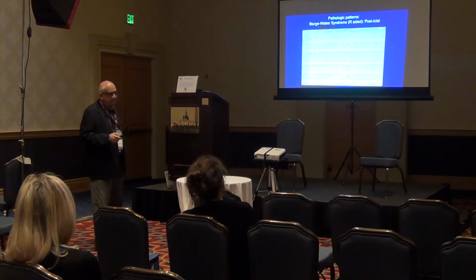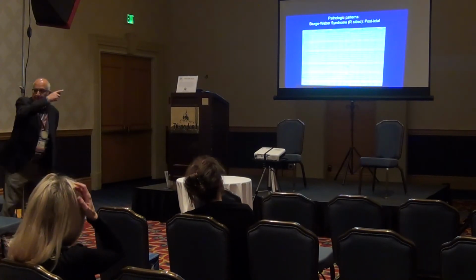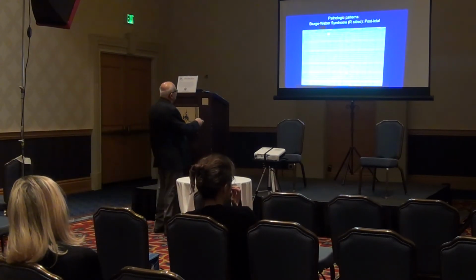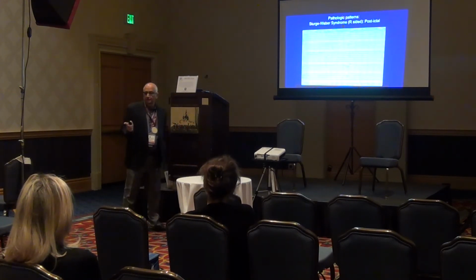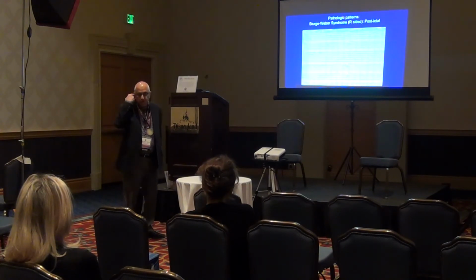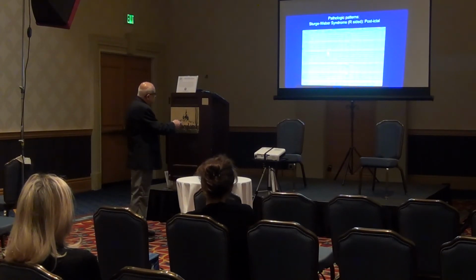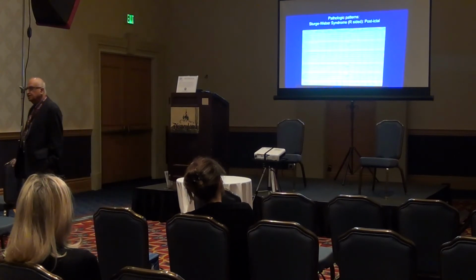So, here is a very interesting EEG. Remember I told you about the bananas, left side versus the right side. So here we have one side, front to back, the other side, front to back. Then remember we talked about the coronal montage? We go from one ear to the other. We go from this ear to the other ear. What do you see? Can anybody describe it? Does this look different than these two? Yes. It does, right?